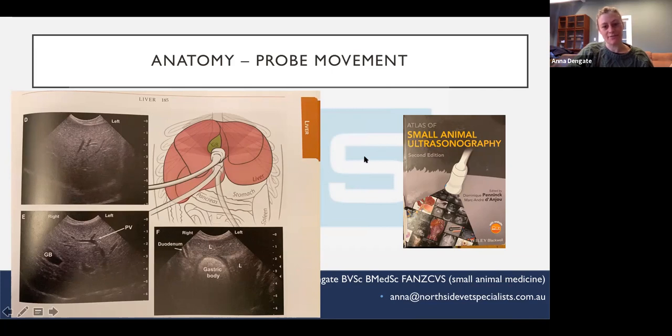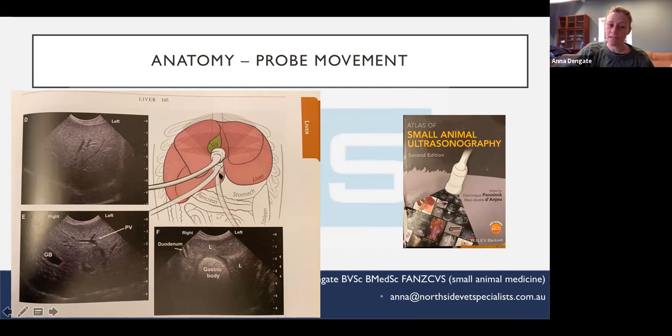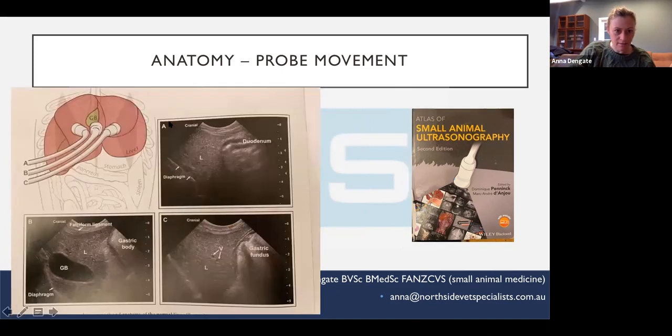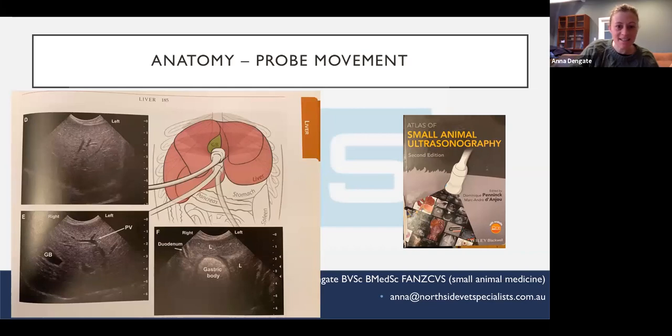Does anybody have any other different techniques that they use? Can I just ask, on that right-hand diagram there, you've now rotated your probe by 90 degrees, haven't you? I don't actually. I often do if I'm looking at vessels and things, like if I'm looking at a focal point in the liver. But this, I don't know if they haven't marked craniocaudal there. Because you can see the shadows. Can you see the shadows? Oh, I see. Yeah. Well, that's a really clever thing to do.